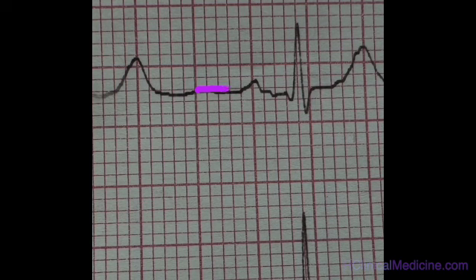This is the baseline, this is the P wave. Here the P wave represents atrial depolarization. Though we call it sinus beat, in this case it is based on the morphology of the P wave. In this particular lead, upright position points to sinus origin. Please remember, SA nodal electrical discharges are so minimal and not recorded in an EKG. The resultant atrial depolarization is the one shown in the EKG as P wave.